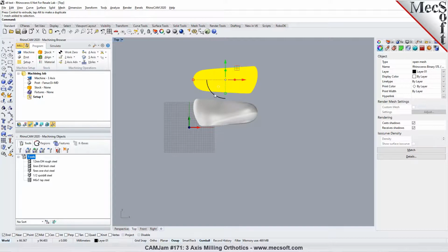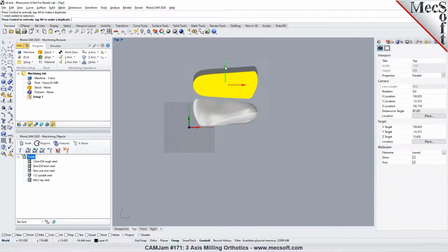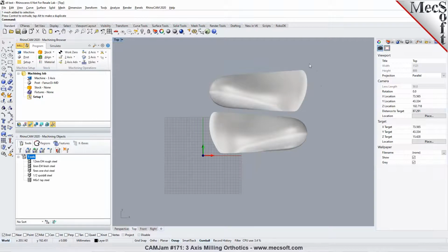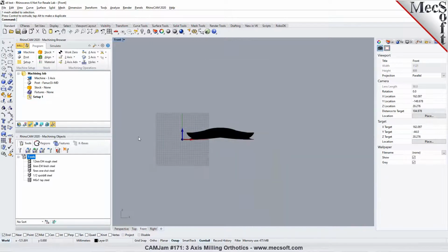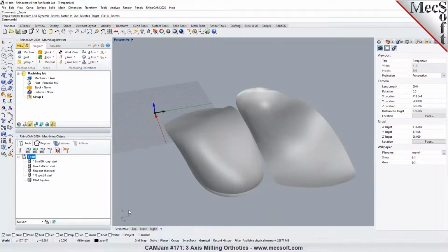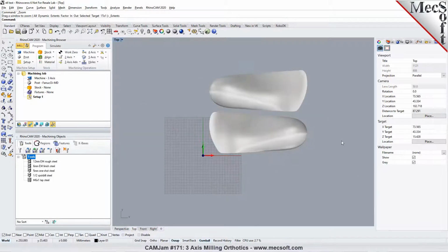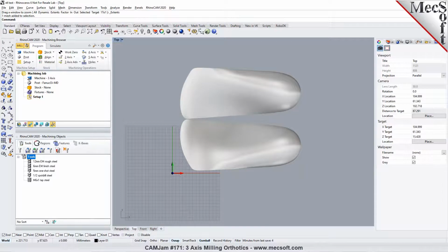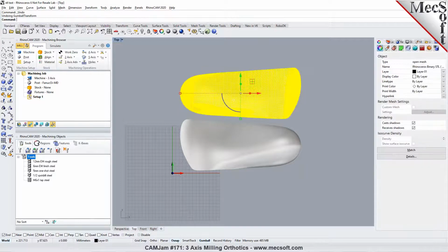Yeah, 180. Oh, okay. Excellent. So you want to basically minimize the material wastage. Right. Yep. You just rotate it. You have tools to do that in Rhino, so you can reorient it. So you want it to basically maximize the efficiency. Yes. So what we did was I rotated this by 180 degrees. Okay. So you can rotate it.